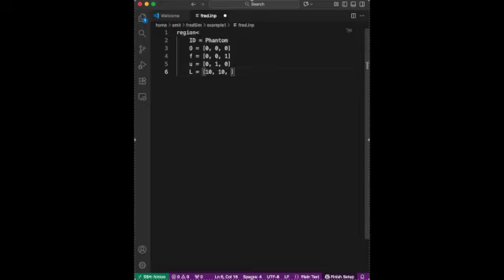My water cube is 10 centimeters in each direction. And here comes the pivot, which is quite confusing. What the pivot says is, you have the cube, and at what point should the isocenter be, at which the beam will be focused. So when I say 0.5, 0.5, and again 0.5, that means at the global coordinate the center of the cube sits at 0, 0, 0. I hope you get the point.